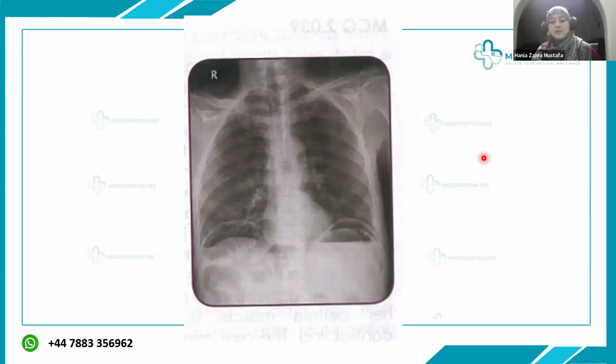Okay, these are the X-rays from your handbook that I've taken. So I'm giving you like 30 seconds to write down in the chat box what your findings are in this X-ray. Then I will tell you the answer.